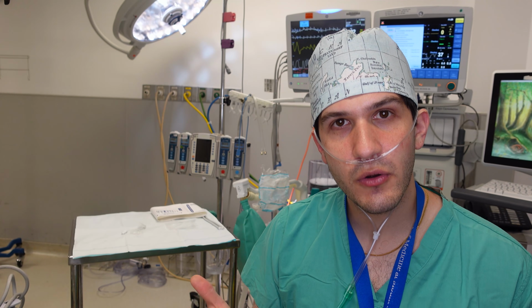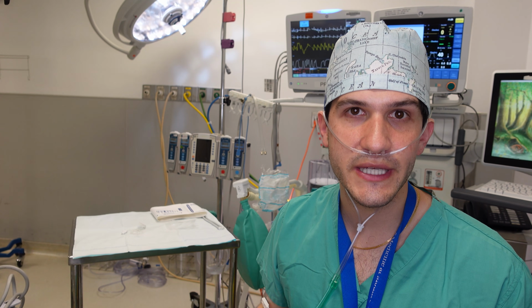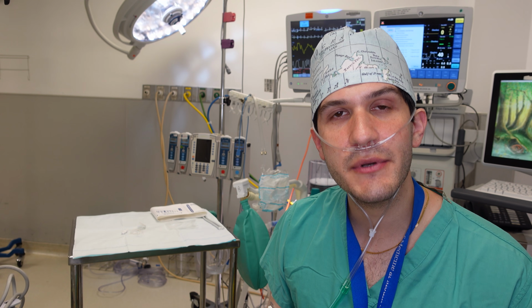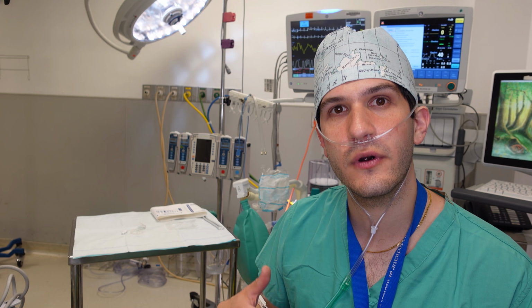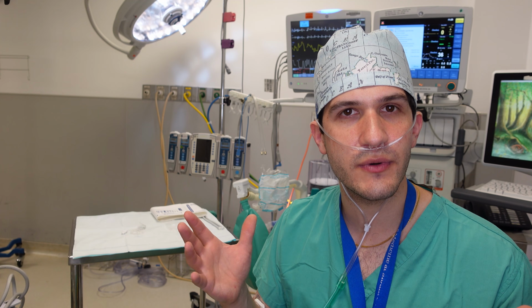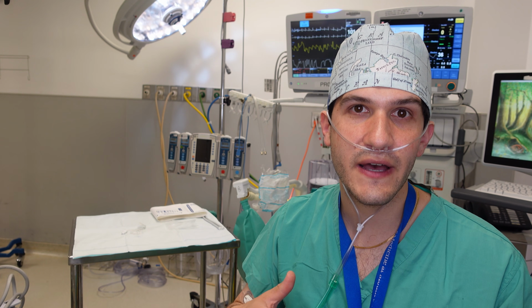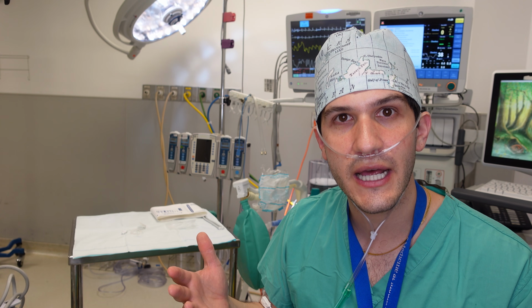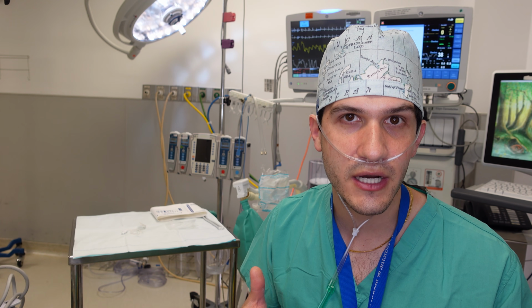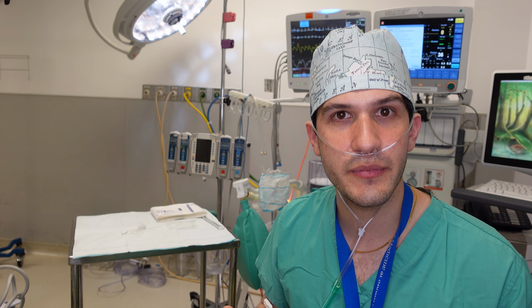In addition to reflecting pulmonary function and showing evidence of diseases like COPD or asthma, capnography can also be really important for understanding how much cardiac output there is, because there tends to be a direct relationship between cardiac output and capnography. So if I have a decrease in cardiac output, I would expect to see a decrease in capnography. So that's something that I need to be attuned to as I'm taking care of the patient and looking at their capnography during surgery.